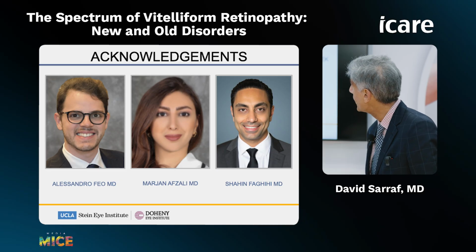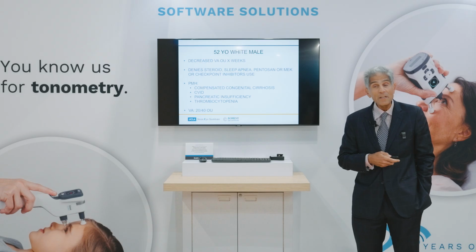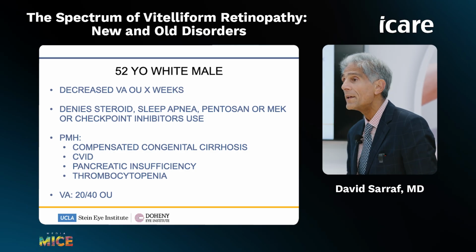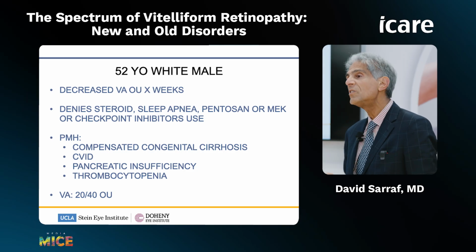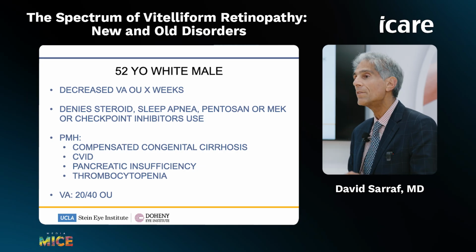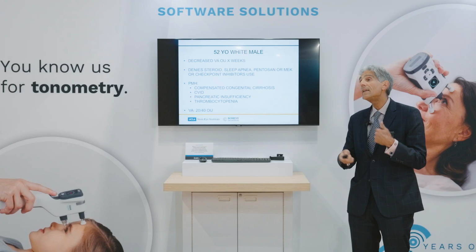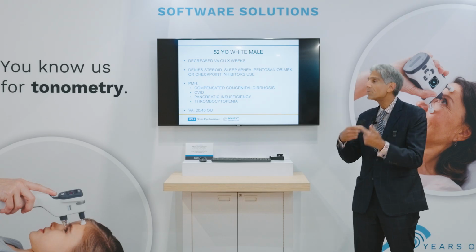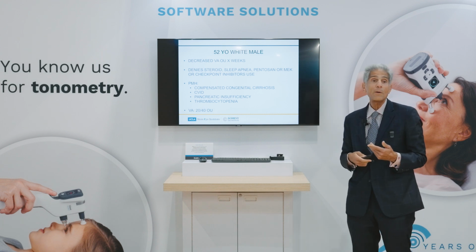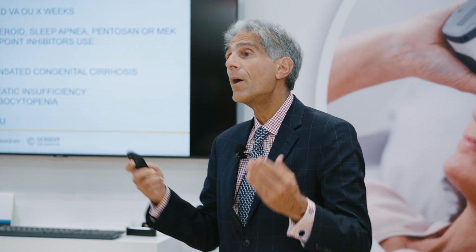contribution to this talk. So this was actually a male patient who presented with a vitelliform lesion centrally in both eyes, and we were unsure of the etiology, why he had the vitelliform lesions. Generally, when you see a vitelliform lesion, it's an indicator that the RPE function is impaired. Normally the RPE turns over shed outer segments, and if those outer segments are not being properly phagocytosed, they accumulate in the subretinal space as this yellowish vitelliform material that can light up on autofluorescence.